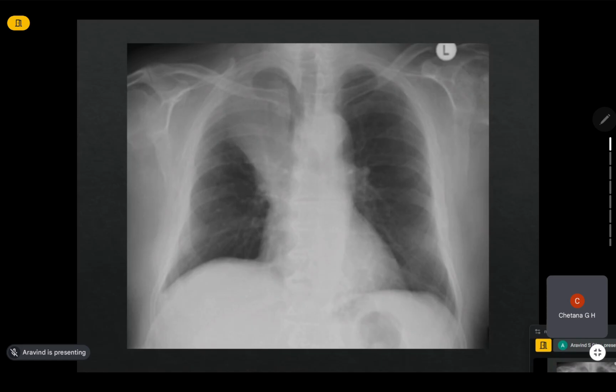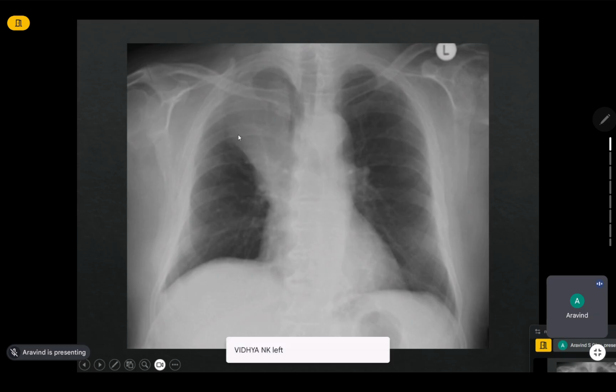Aortic dissection? Left upper zone is, right upper zone is... Oh, no. Effusion. You also observe the trachea, towards the same side. Atelectasis. Very good. It is atelectasis. The homogeneous opacity without any air bronchogram, with the trachea shifted towards the same side. So this is lung collapse, atelectasis.